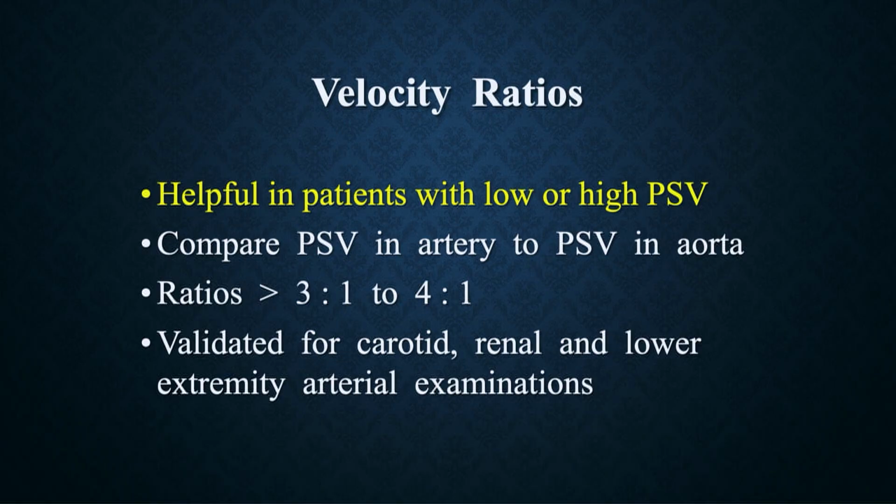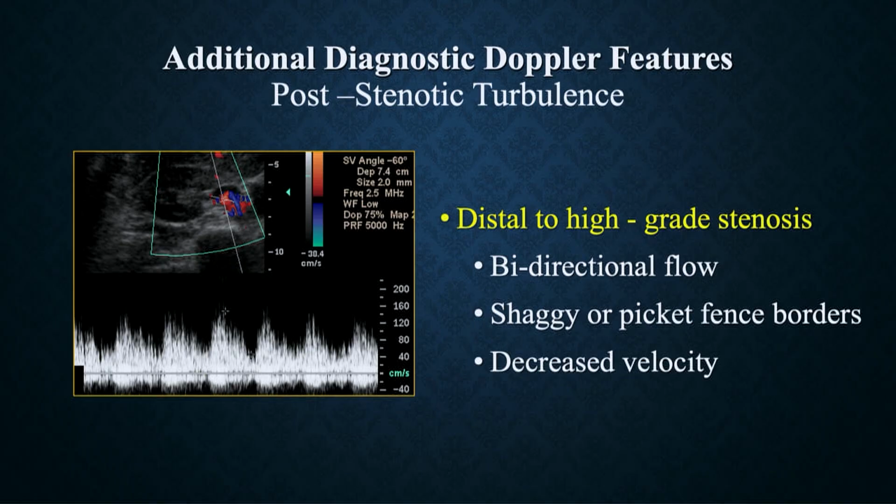with stenosis. And again, these have been validated for numerous applications, for the carotids, for the renals, and for the lower extremities. And we've already talked about poststenotic signals. I emphasized those when we talked about the carotid arteries. And also, we will see that with these branch vessels as well.